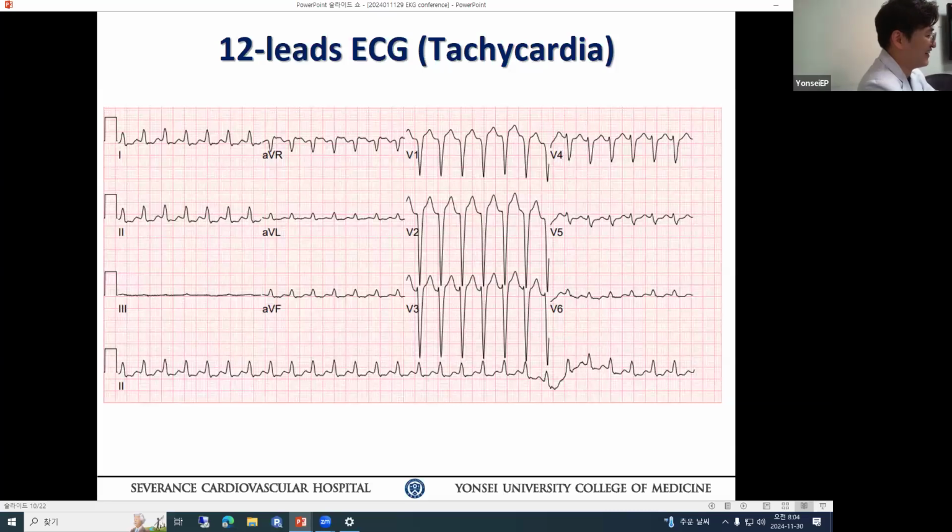Cardiologists like to mention left bundle or right bundle, or not left and not right, and I don't know what kind of pseudo block it is. So because we are starting from P, where is P?